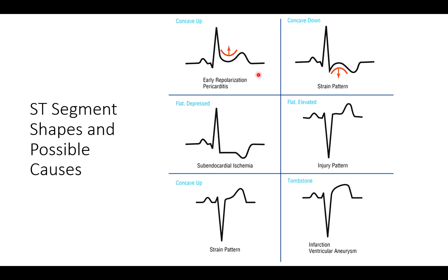So again, there might be a couple of things that we have to confirm. If I see one thing, I need to look for one, two, three other things to confirm. That's something when we look at an ECG rhythm, where our eyes are constantly scanning. We're looking all over the page, because if I see one thing, I want to know, okay, part 1 was met. Was part 2? Was part 3? Was part 4? Maybe that's this, right? So again, here you see maybe a strain pattern. Could be problematic, leading to something like an infarction. We'll talk about some of the progression that we may see.